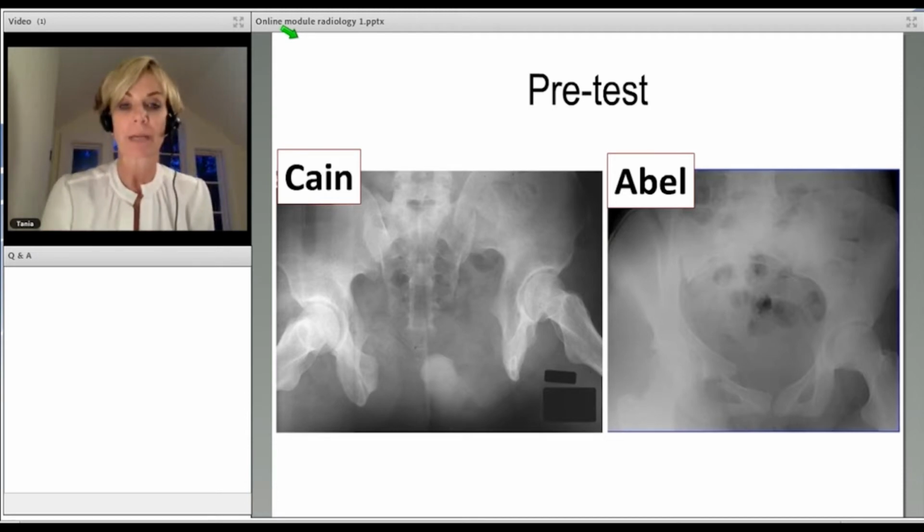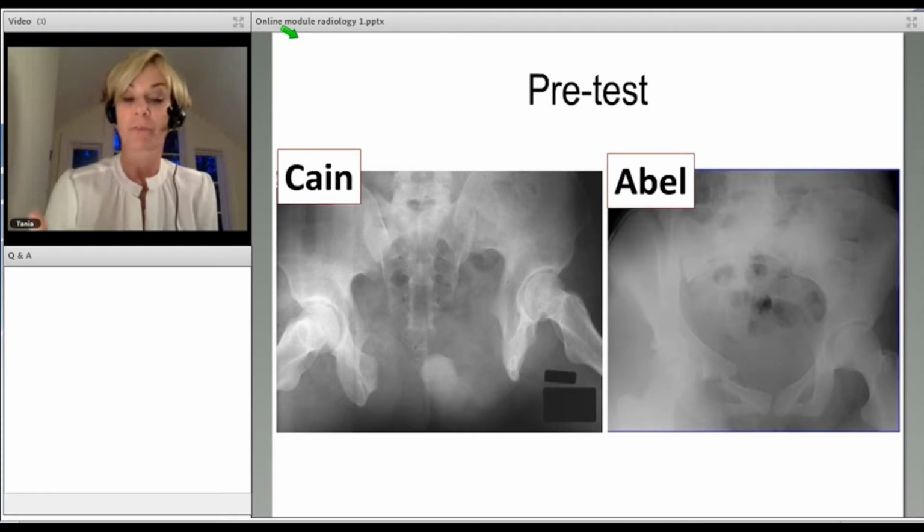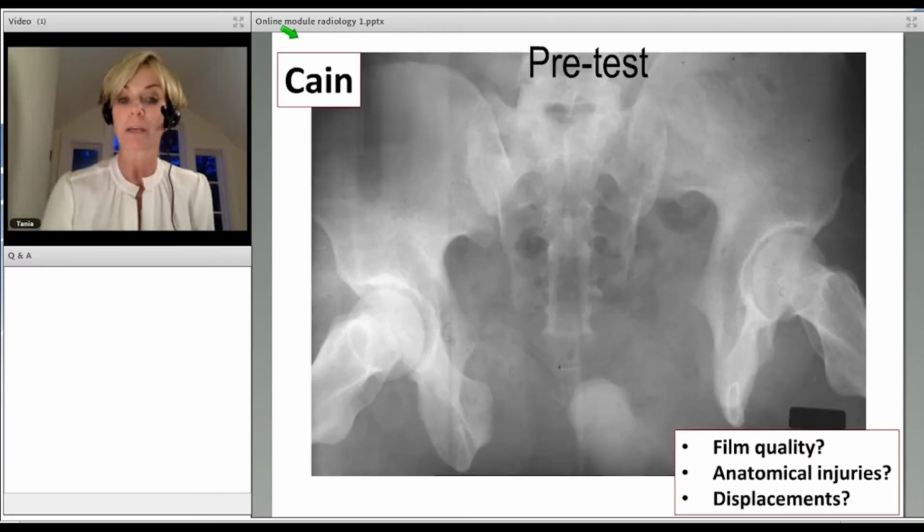I want you to take a minute. Now, the luxury of our online pre-course platform is that you can pause. I'd love it if you take a moment, look at the x-rays, write down your thoughts. But for each patient, I want you to think about the following questions.